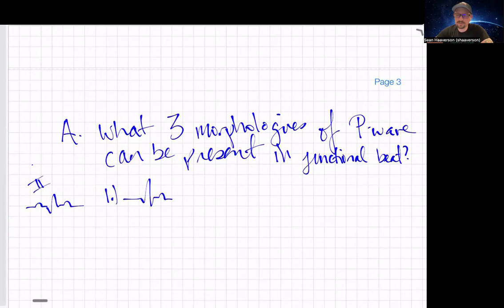It could be buried within the QRS, happening simultaneously, where we wouldn't see it because the mass of the ventricles is producing way more electricity than the junction that's creating this P wave. Or we can have a P wave that presents inverted. And so if the P wave is upside down, one variation in a junctional beat might be that the P wave is upside down preceding the QRS, almost as if it's in the same position it should be, but it's inverted.